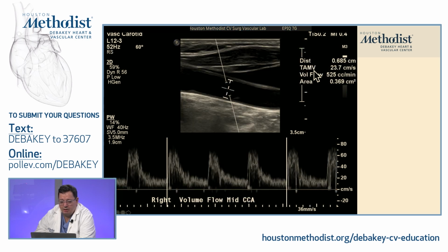One of our interesting methods to differentiate between bilateral carotid stenosis is that we measure the flow volume. We borrowed it from our AVF protocol, where, with a fistula, it is very important to have a flow volume done. Throughout the cases today, just remember these different flow volumes. We call everything normal between 350 and 800, but probably up to 600. We measure this flow volume from the diameter of the CCA and the mean flow velocity, giving us a flow volume of 525 cc per minute.